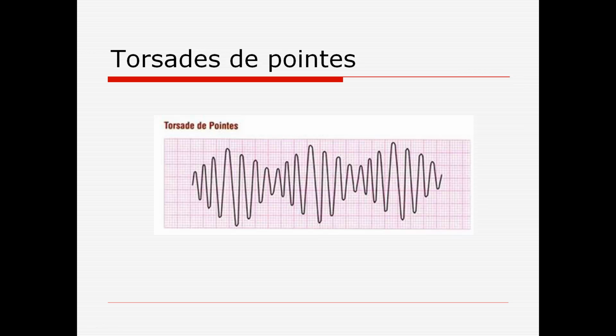Patients can be awake in some of this. Sometimes they're not. Usually electrolyte issue, but this one is also a ventricular dysrhythmia.